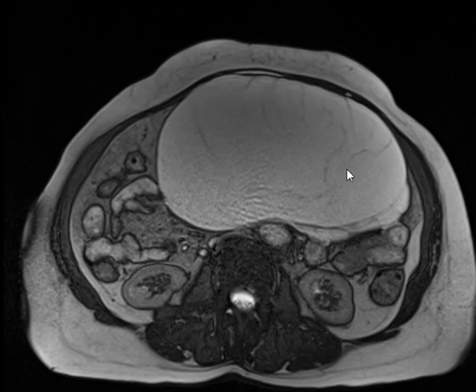When you see an ultrasound, you have a hydatid cyst. What are the criteria that you look for? For the daughter cyst? There is a daughter cyst. Does hydatid take contrast enhancement? No, not usually. The enhancement will be only in the periphery. Is it in the cyst or outside? It's the fibrous capsule. Okay?